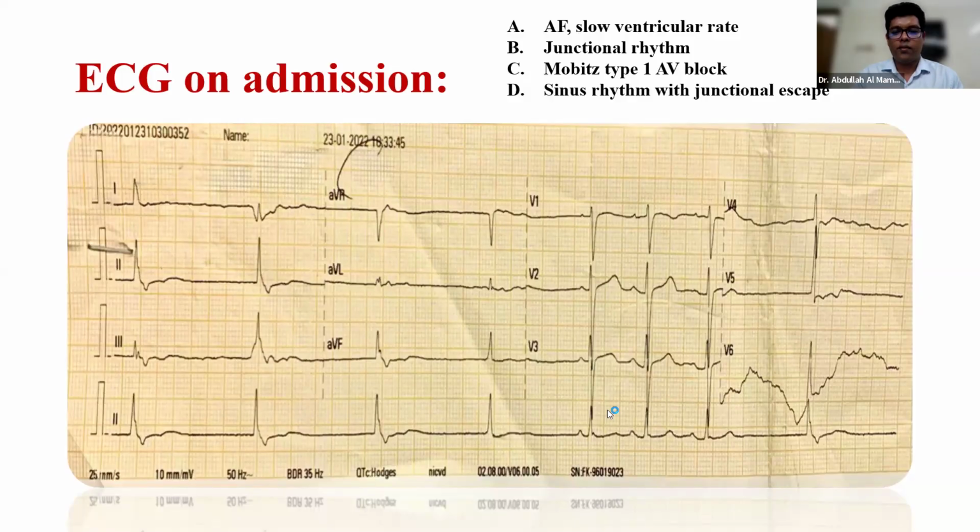So this ECG shows bradycardia at the rate of 45 beats per minute, and on first impression the rhythm appears irregular. Look at the rhythm strip at the initial part, the first 4 beats, in which the P wave is absent, rather there is presence of a retrograde P wave.